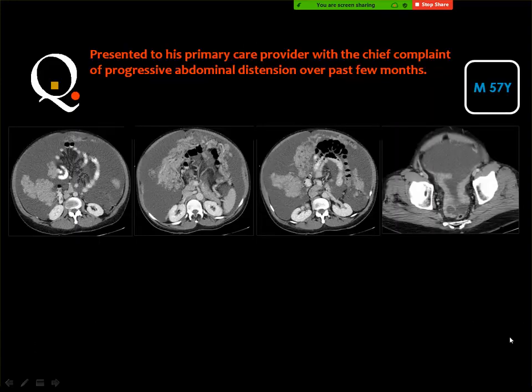This patient had progressive abdominal distension. Peritoneal cake. Pseudomyxoma peritonei? No, this is possible, but you cannot diagnose pseudomyxoma unless you see it in the liver or the spleen. But here you got an omental cake or omental deposits with massive ascites.